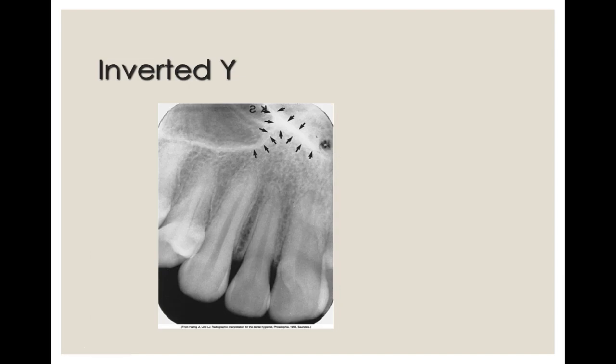Next is our inverted Y. The inverted Y is the intersection of the maxillary sinus and the nasal cavity. Here you have your maxillary sinus and your nasal cavity, and it's called the inverted Y because it looks like an upside down Y.